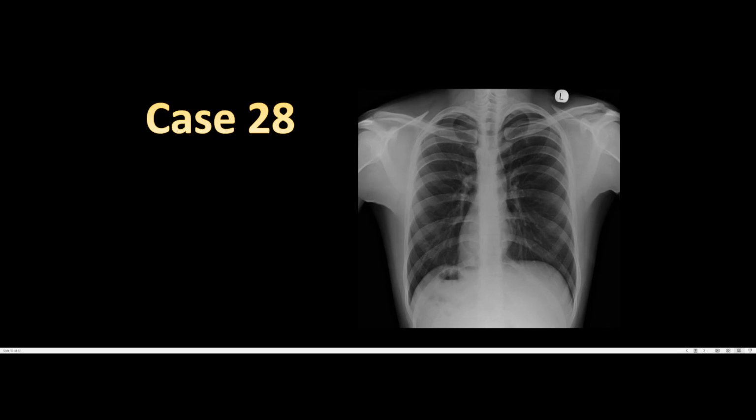Again, incidental findings. Look at case number 28. This is very obvious. The spot diagnosis is that this patient has dextrocardia. You can see it in this patient's X-ray right here. And dextrocardia can mean a whole lot of things. Remember, there's another incidental finding along with dextrocardia. You can also see the stomach, containing a gas bubble. It's now on the right side and not on the left side. That means the liver and the stomach switched sides, and the heart switched sides. So now you're thinking situs inversus. Maybe this patient has Kartagener syndrome, especially if we gave you a patient history of infertility, recurrent infections, and a whole bunch of things. So this is a case of situs inversus, by the way.